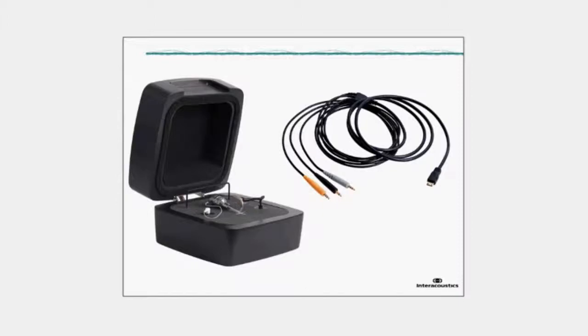The TBS-10 is a passive hitbox, and it requires a connection to the Callisto in order to perform the measurements. This is because there are no internal components within the TBS-10 to control and drive it. Therefore, the Callisto is the brain for the TBS-10.